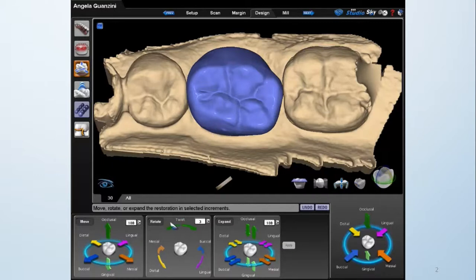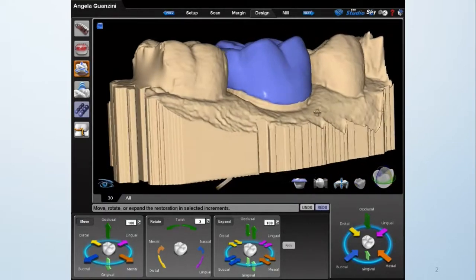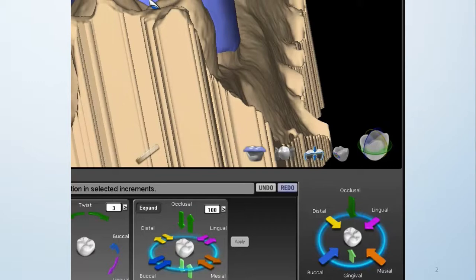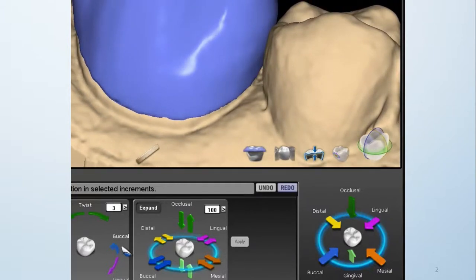It's not aligned, right? So using your big incremental change tools for tooth positioning. Now look at how nice and aligned that occlusal groove is. I'm also then going to rotate in incremental change tools and look and see how does everything line up. You must rotate. Look at it down that distal view. How do the cusps align? How does everything look? Well, when I'm looking at the model here, I can see barely on the screen. It keeps zooming in on me, but I can see that my marginal ridge is really, really high.